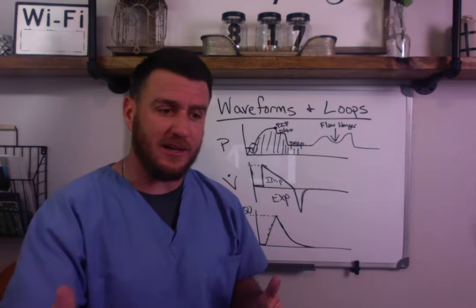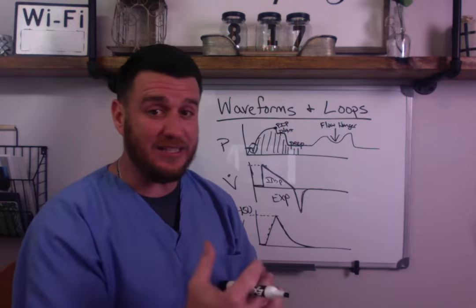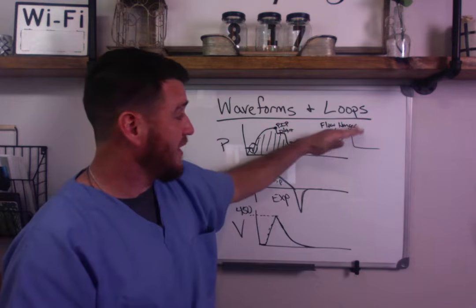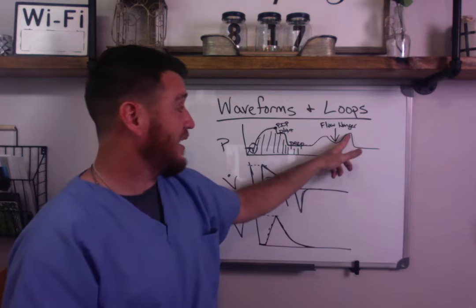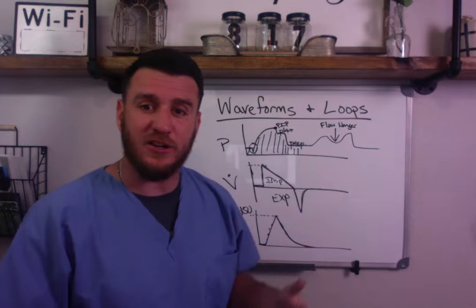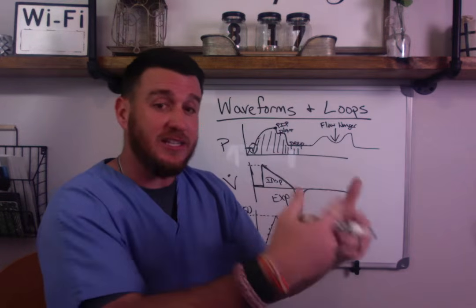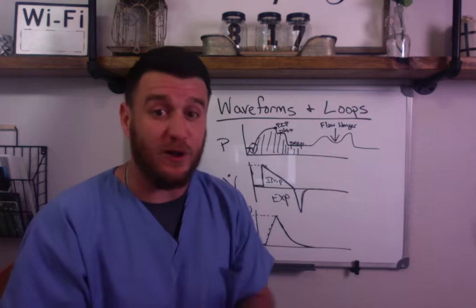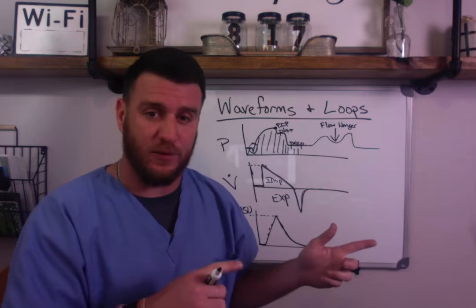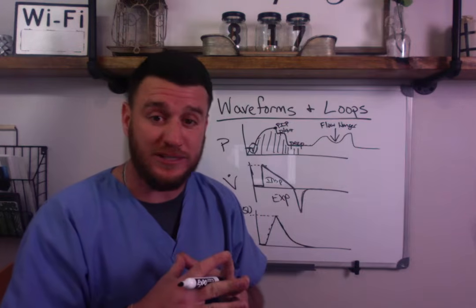Now, you typically think, well, if I increase flow, I'll increase pressure. But that's not the case when you're dealing with a patient who's flow hungry, because you had an asynchronous situation here. So the diaphragm is trying to come back up while the vent is still trying to give a breath, and you get a sharp rise in your pressure waveform. And so when you catch up to the inspiratory flow that the patient is asking for, not what you're given, but what you're asking for, then you'll find that your peak inspiratory pressures won't really increase that much.